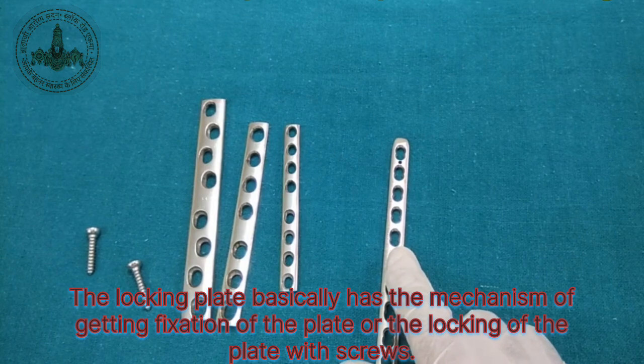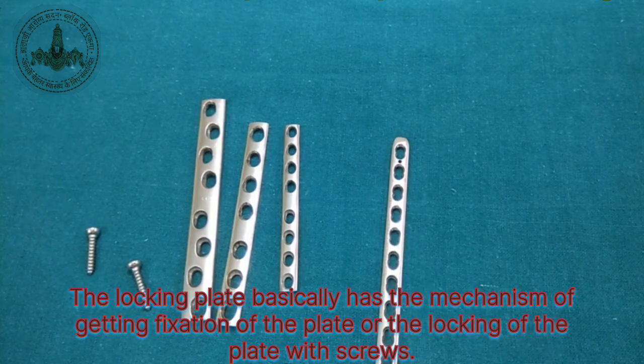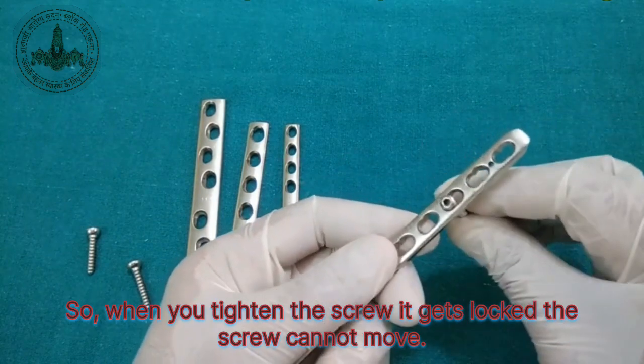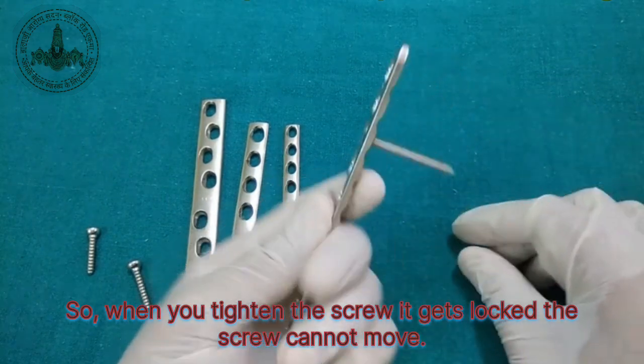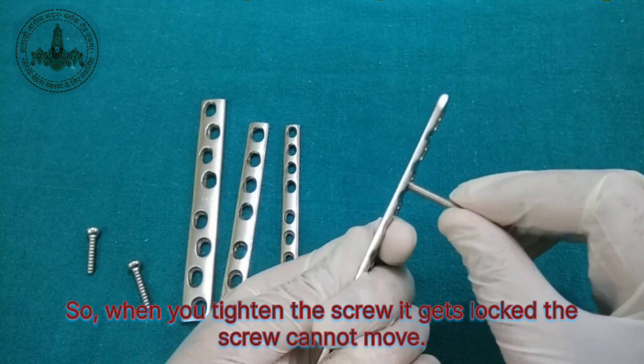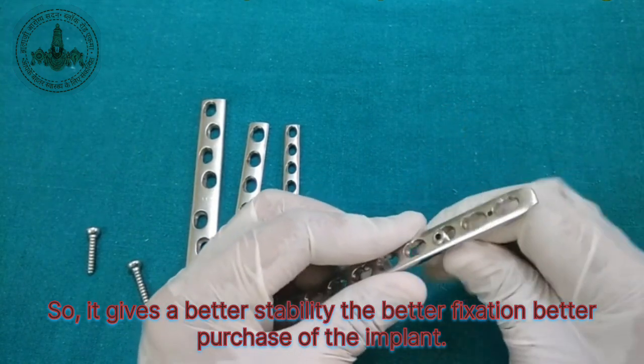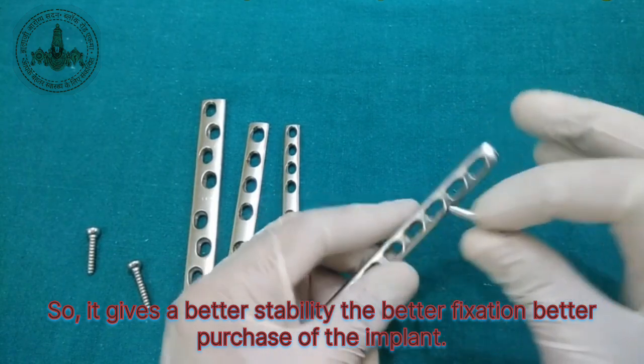The locking plate basically has the mechanism of getting fixation of the plate, or the locking of the plate, with screws. So when you tighten the screw, it gets locked. The screw cannot move. So it gives better stability, better fixation, better purchase of the implant.